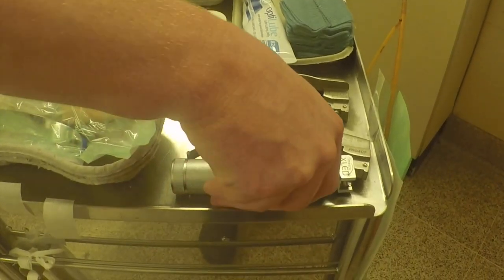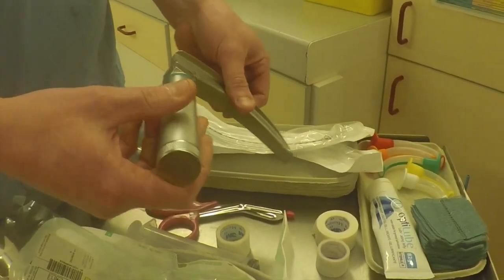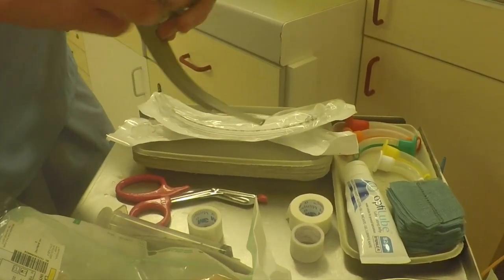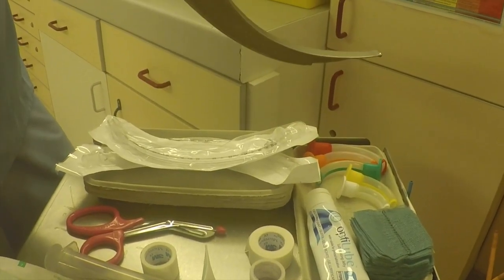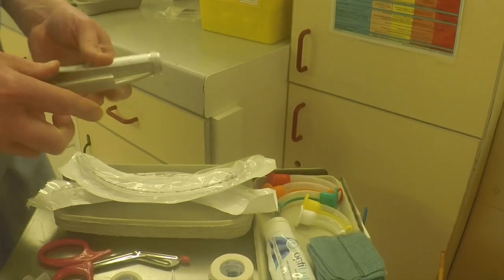Finally, we have what is called a laryngoscope, which is an instrument that is used for intubation or endotracheal tube insertion. It is used to lift the patient's tongue for a clear view of the larynx and for safe endotracheal tube insertion. It is important that patients are paralyzed with muscle relaxants during this procedure.